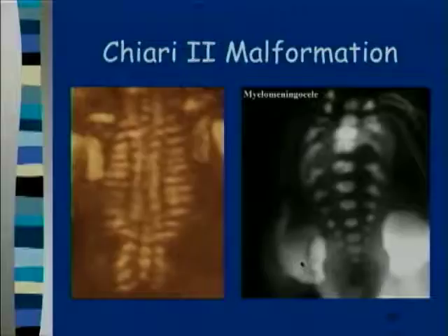Now this is a patient that has a Chiari-2 malformation, and I just put this here to show you that the rendering can sometimes be misleading. So this was the spine coming down, and then you can see this widening out here. And I thought it was really beautiful, and 3D was showing the spinal abnormality nicely. And then when I heard the fellow dictating this case, I realized she was dictating it as if it started here. And to me, the defect started right up here.